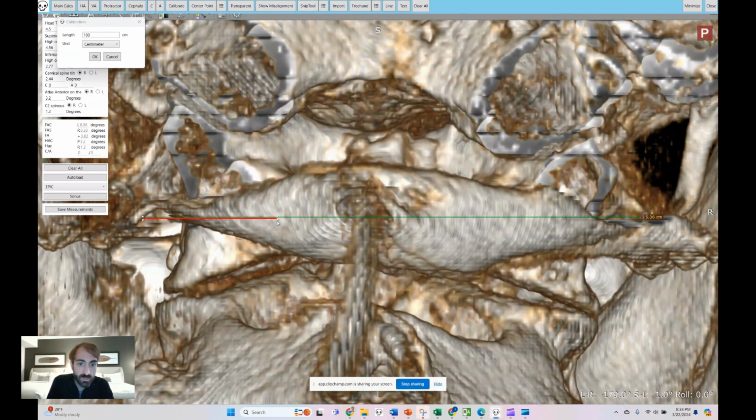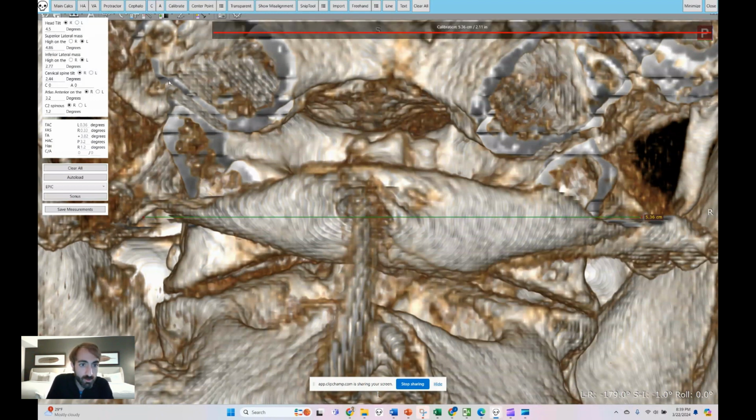And this is roughly right or 5.36 centimeters long. So let's drop our condylar buttons here and here, and here and here for a condylar circle of 3.3 and an axial circle of 8.53. I like it. 8.24. Let's go for an 8.24 over a condylar 3.33 for a nice little misalignment.